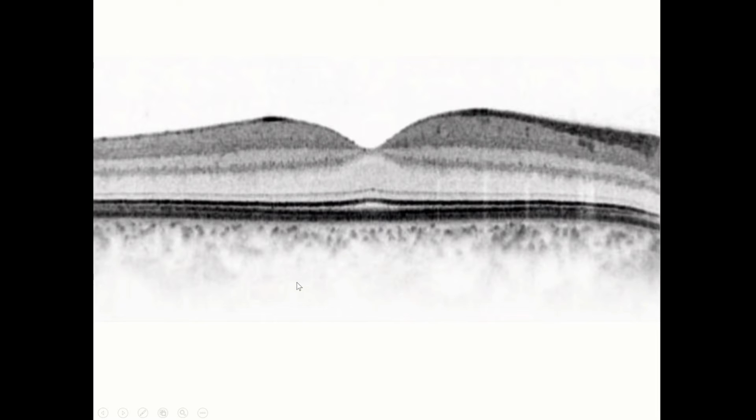So this is another slice of the OCT scan which is showing a negative image. The important thing to see over here is that the cones are slightly more in number and taller. That is the reason the external limiting membrane and the ellipsoid layer, which you're seeing as black, tend to arch forward, and it's important not to mistake this as an abnormal feature.